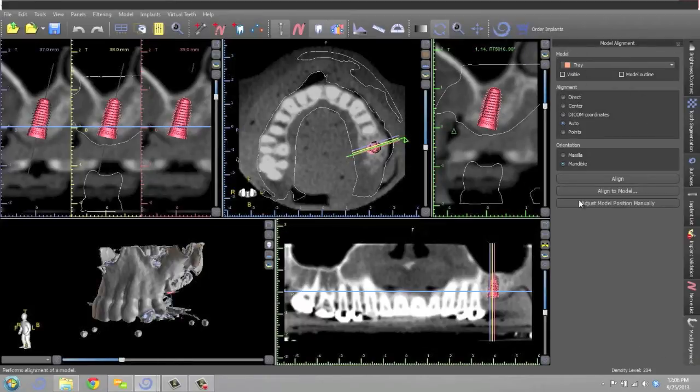Over here are where you manipulate the software, basically. And on the right-hand side, there are all these different tabs, which I'll identify for you. These tabs are like macros, and these control the basic functions that you use. There's always two ways of getting to the tools that you use.